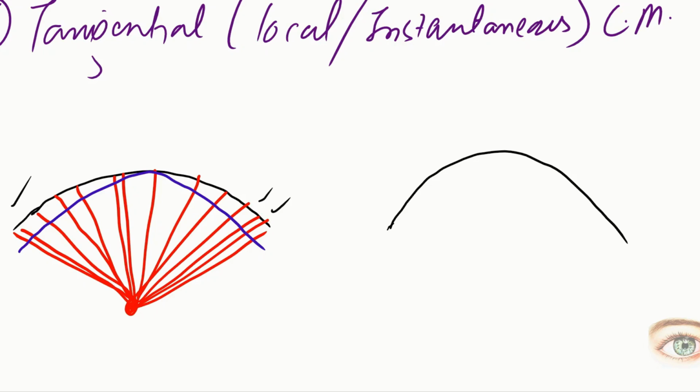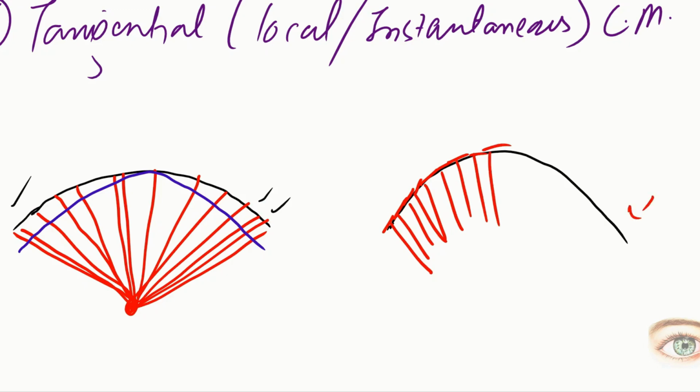So to resolve this problem, a tangential map was introduced, which will take the tangent of each point, and with the help of this, it is going to build a reference line, and due to this, a very slight change in the steepness of the cornea will not be ignored.